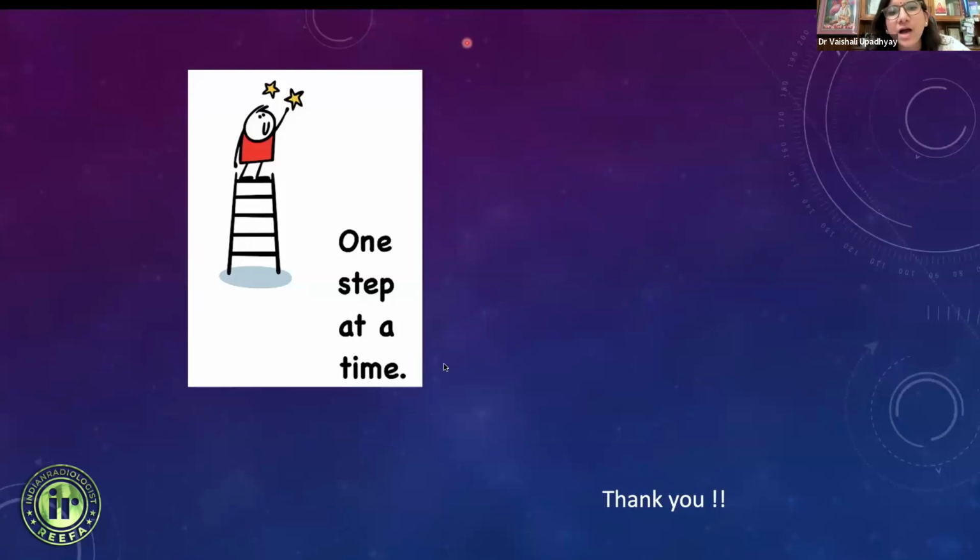So someone is asking how to see a U-shaped or an L-shaped tear. For this, you have to see the shape of the tear in all the planes, right? So once you're assessing the tear morphology, I would always say that you need to see in all the planes. You cannot make it out on an axial, but if you see coronal or sagittal and also go back to your axials, then putting it all together, you'll be able to identify the configuration.